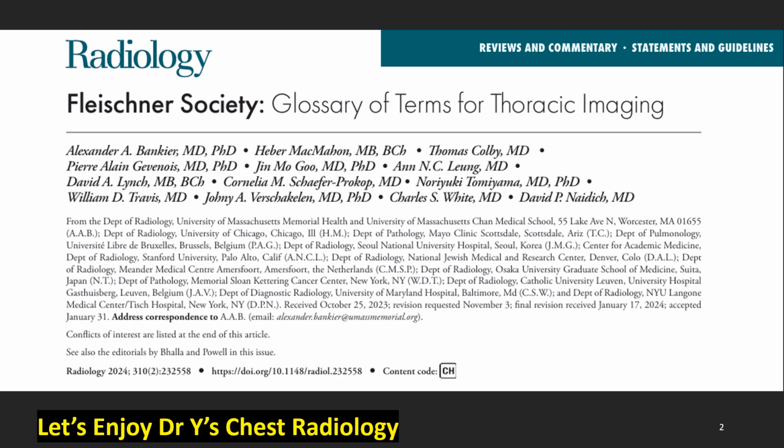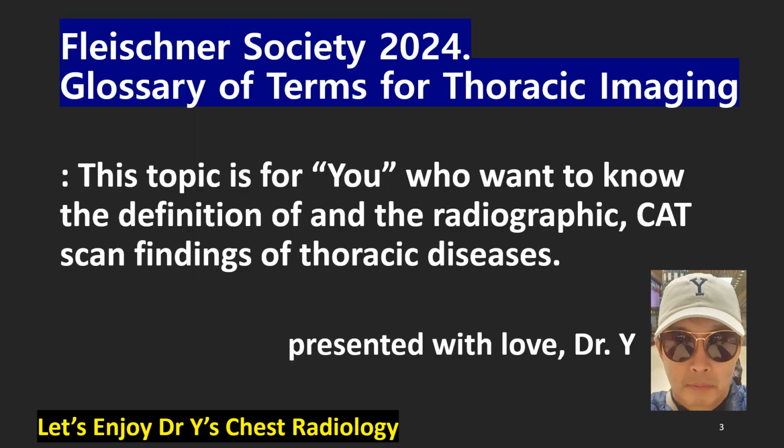This topic is based on the Radiology Reviews and Commentary, Statements and Guidelines: Fleischner Society Glossary of Terms for Thoracic Imaging by Alexander A. Bankier et al., Radiology 2024, 310. This topic is for you who want to know the definition of, and the radiographic and CT scan findings of, the thoracic diseases.